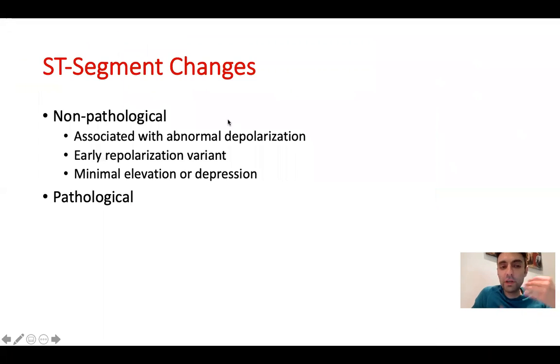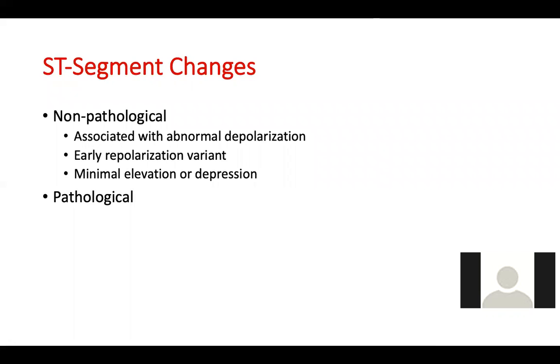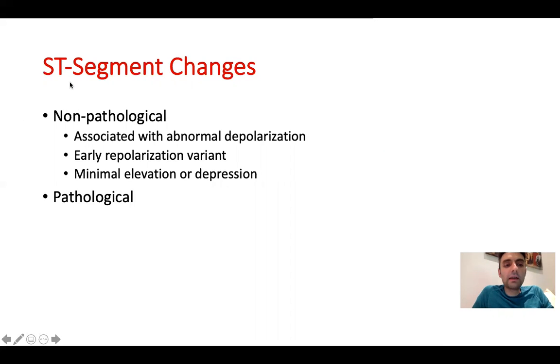Just to orient your thinking, whenever you see ST segment changes, these could be pathological or non-pathological, meaning significant or non-significant.